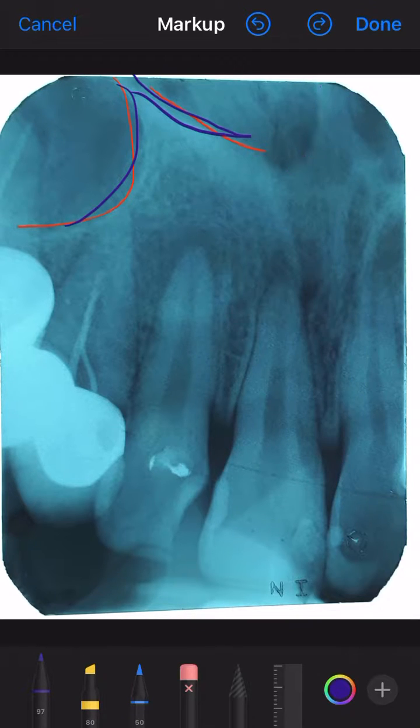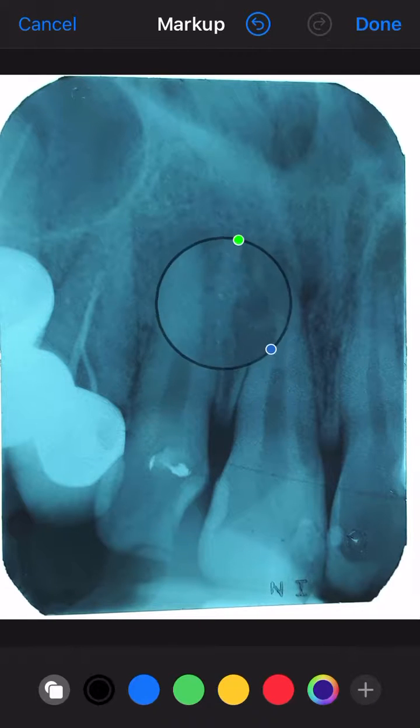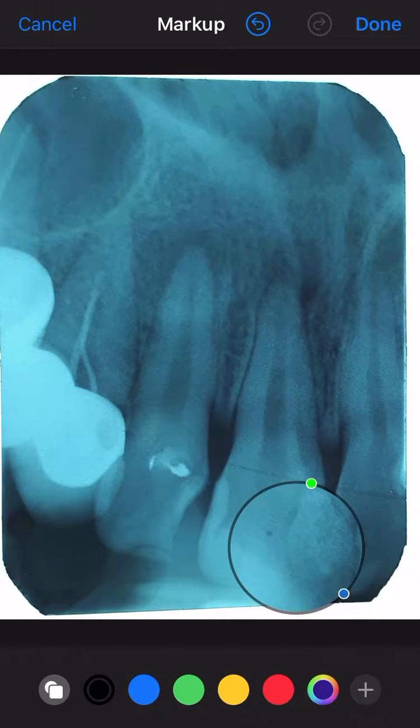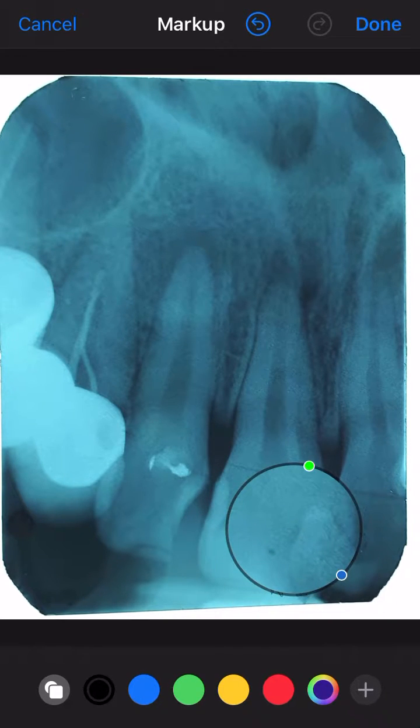Which are our teeth of interest? 1-2, and then the adjacent tooth. Let's assume that it's a canine. Yes. So what are we seeing at the teeth? Can we go to the crown first, please? And the crown, what are we seeing? There is secondary caries, possibly secondary caries setting in. There's radiolucency. Again, very good.